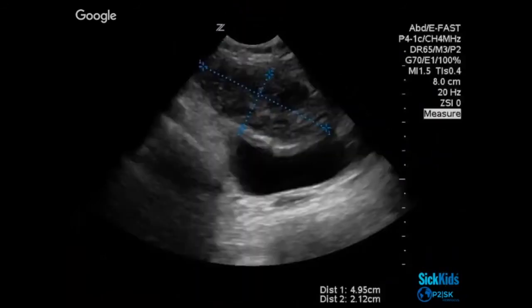When we look at another image of similar style, you can see there's a bladder, but what's interesting about this is that this particular object that we're measuring is superior to the bladder in this view. So it's important to remember that with things being free moving within the pelvis, you might see large masses superior to the bladder that may actually be connected to the reproductive tract, and not to get thrown off by that.